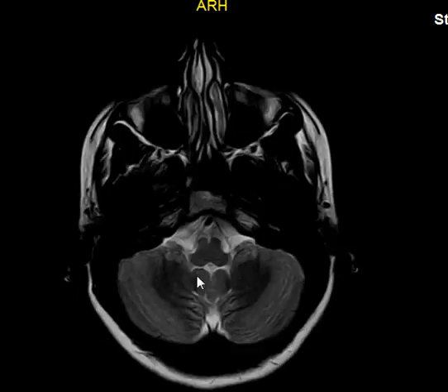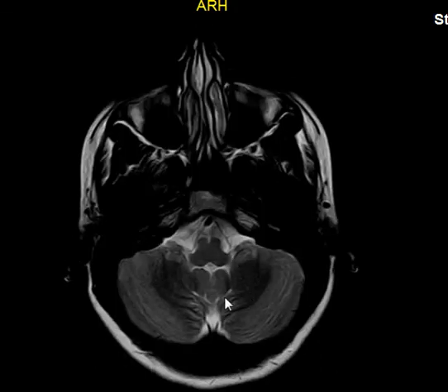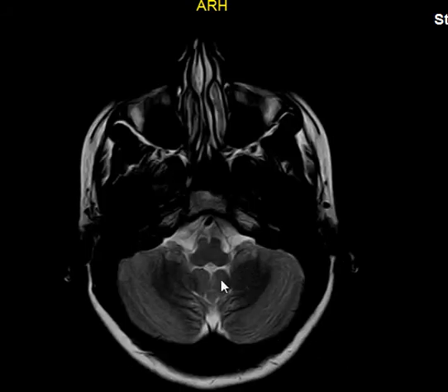And if you go down, depending on the thickness of the cuts that we used, this is a thick cut, unfortunately, it's not so obvious, but you should see somewhere here some connection through the small inferior cerebellar peduncle. These are thick cuts, so it might skip it. Now, if you look in the midline, there are some things here that connect both cerebellar hemispheres.